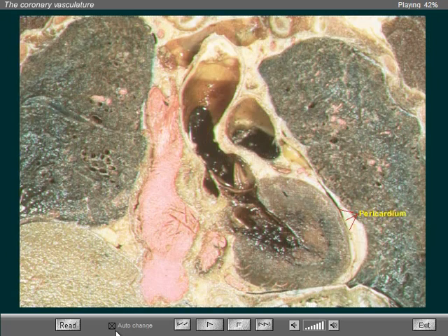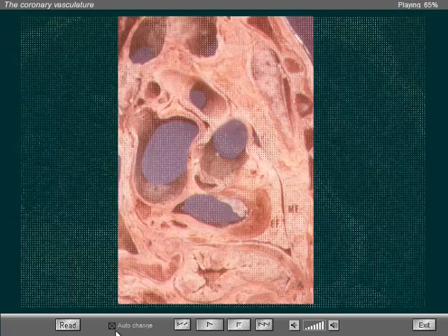The second coronal image is dorsal to the previous one, showing the pericardial envelope. Note that cephalically it stops close to the pulmonary trunk. The superior aspect of the pericardial sac covers the ventral aspect of the great vessels, and dorsally it is not seen going as high as ventrally.